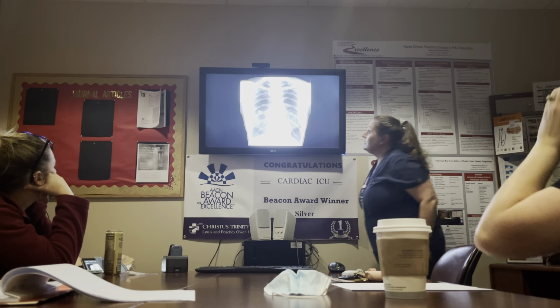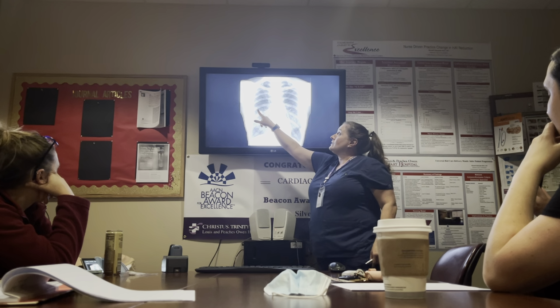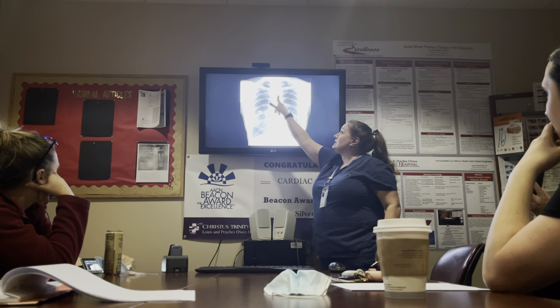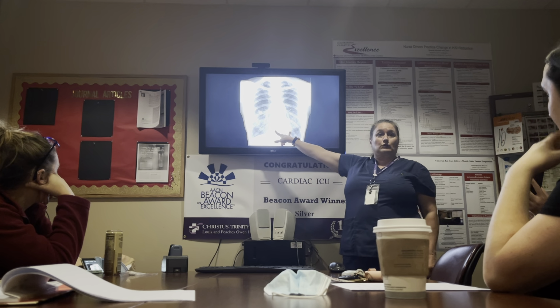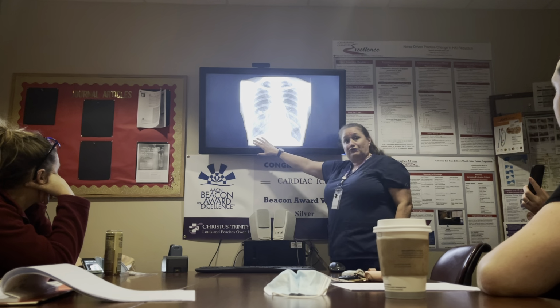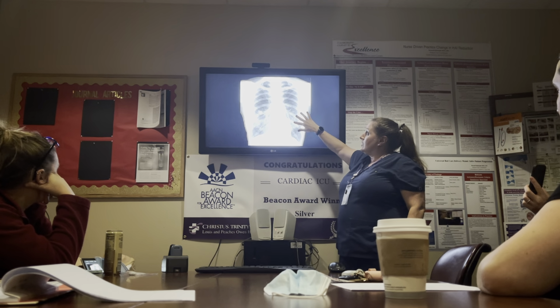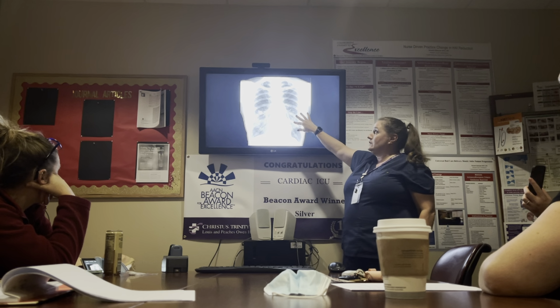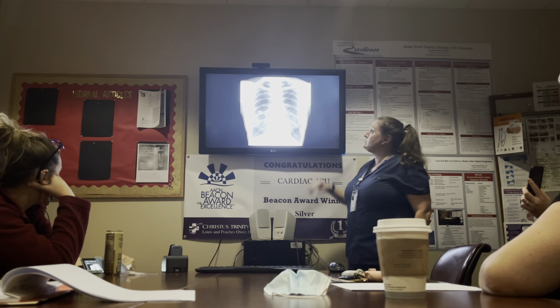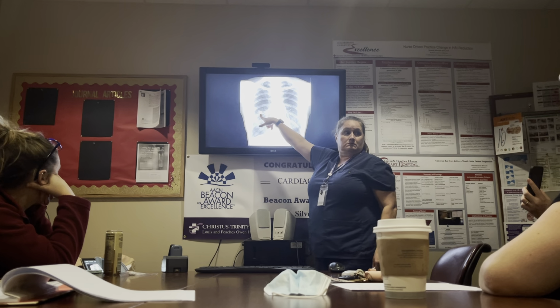Okay. This is another picture. I'm going to go right for the bang for the buck. It's a lung nodule sitting right there. But there's the aortic knob. Cardiac silhouette is skinny because this is a COPD patient. Diaphragms are flattened like we talked about earlier. This is a hyperexpanded lung because they're probably in extremis with ribs that are wider than they should be as far as the distance between them. So this patient needs to have that looked at.